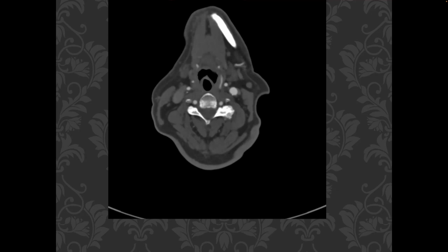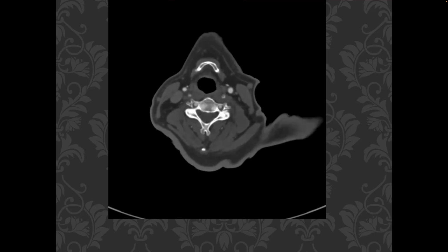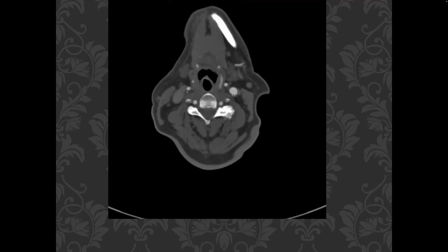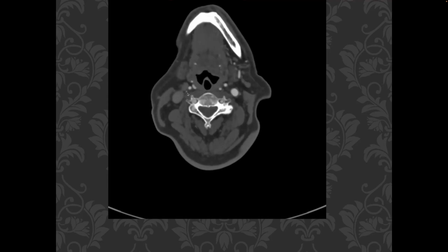In this carotid, as we'll go up, here's common carotid artery on both sides. Even the commons are different size. Here's the proximal ICA on this side, right? Here's bifurcation. Here's bifurcation on this side. Now we're comparing this carotid to this one. Well, this is a huge difference in size.